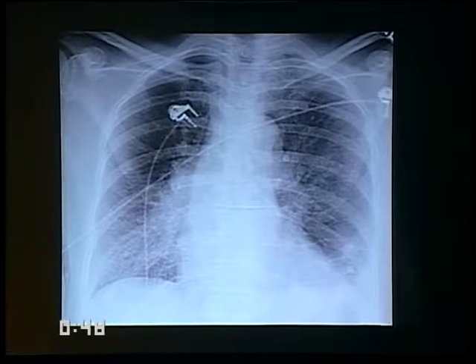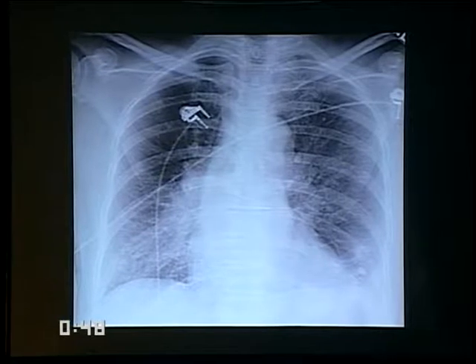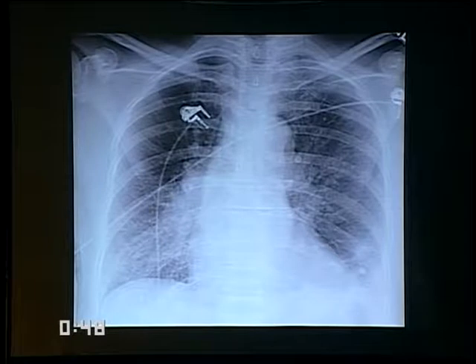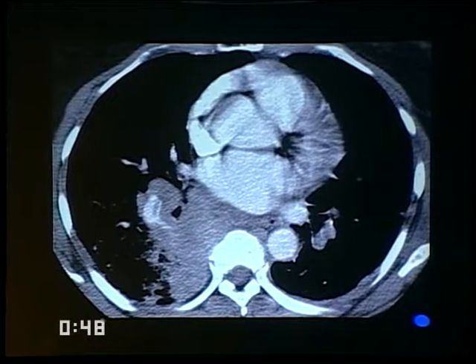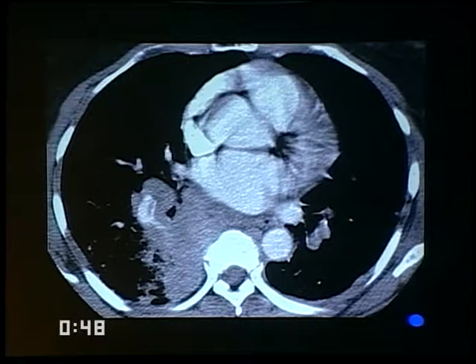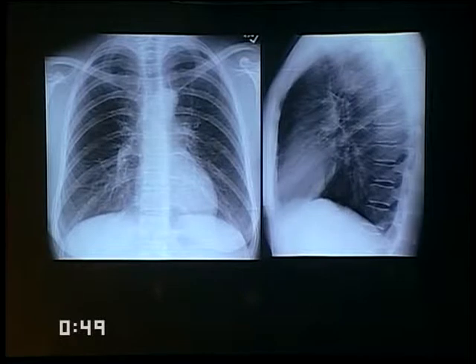Another example of a patient coming into the emergency room with symptoms suggestive of possible pulmonary embolism. A dense and large hilum should make one suspicious. This is enlargement of a degree greater than one might expect from just PE. One might suspect that there's decreased perfusion in that lung. On the CT scan, not only do we have bilateral pulmonary embolism, but we have a large mass, which is a primary lung cancer with associated partial atelectasis and consolidation. So just another example of how we can pick up incidental findings that are not suspected initially.